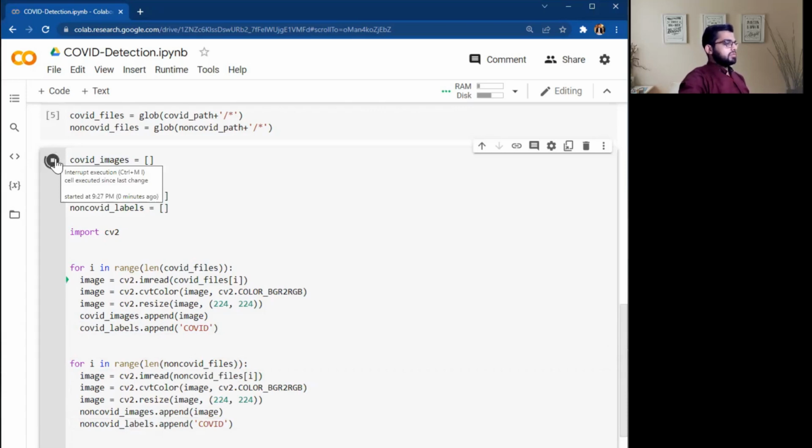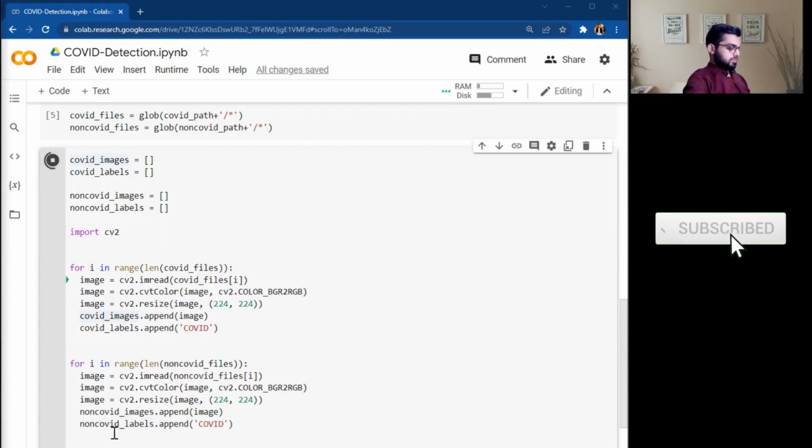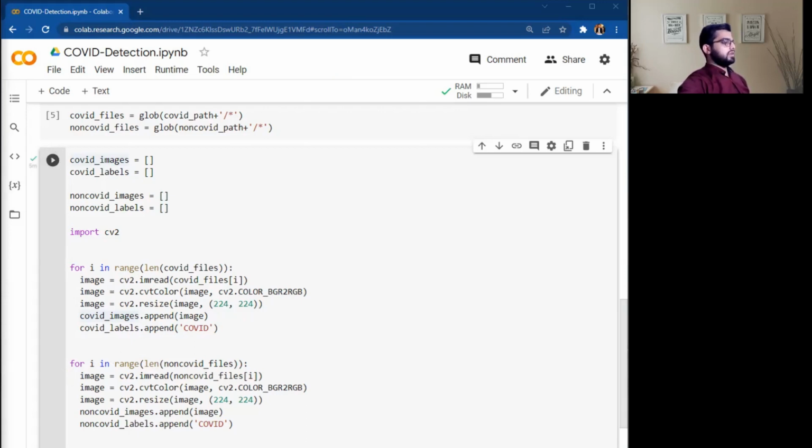It will take some time. It took 5 minutes 52 seconds to complete, so around 6 minutes.